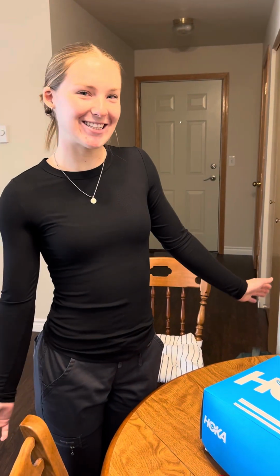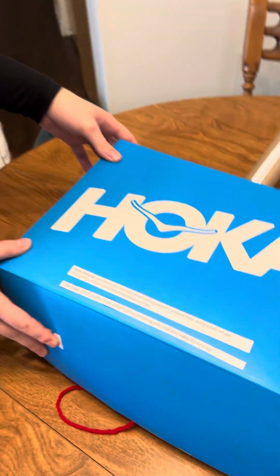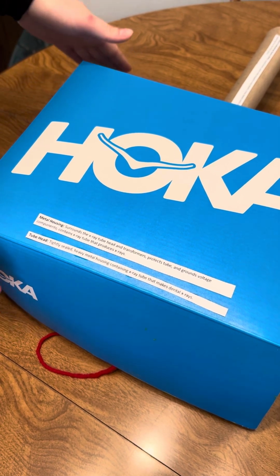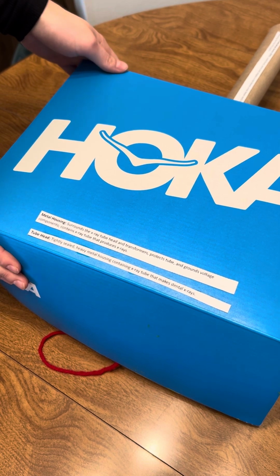We're Team 6, and this is our tube head project. My name is Kelsey. I'll be showing you the outside. This is the actual x-ray tube where all the x-ray components are and what actually generates the x-rays. It's in a metal housing that protects the transformers, protects everything in the tube, and grounds the voltage.